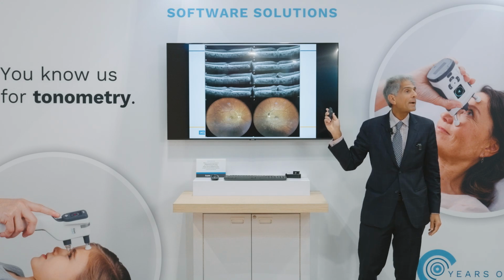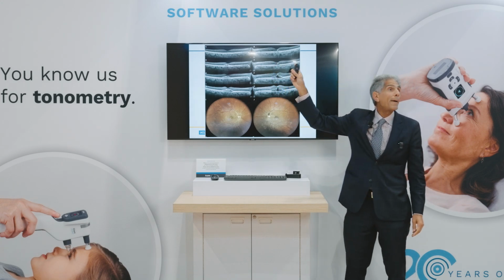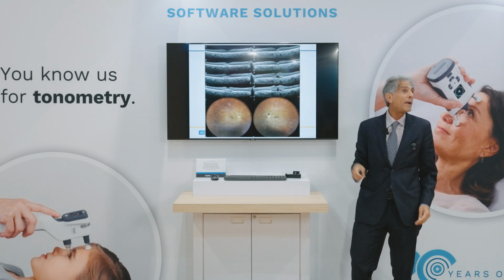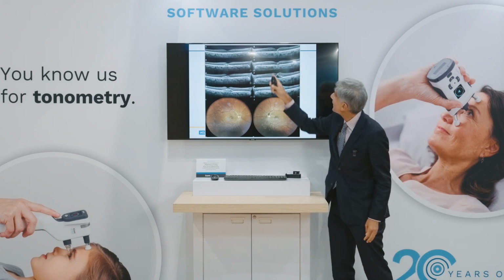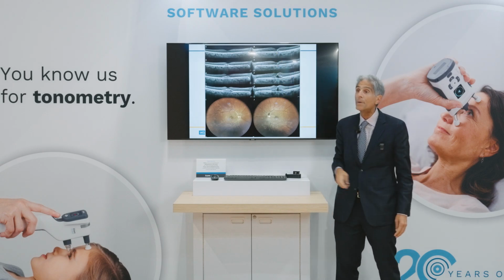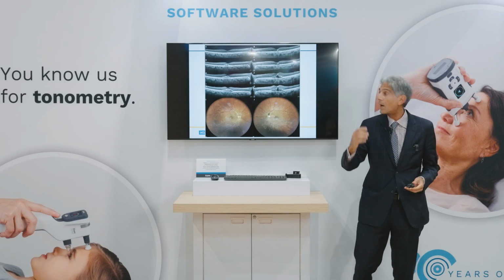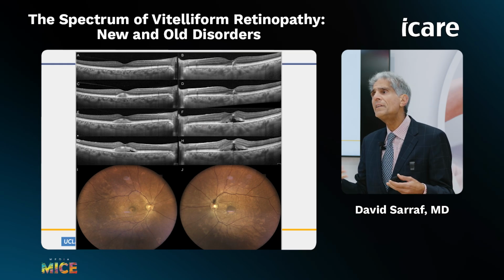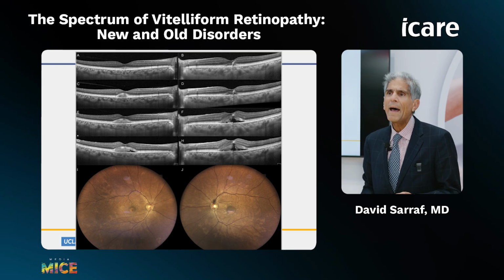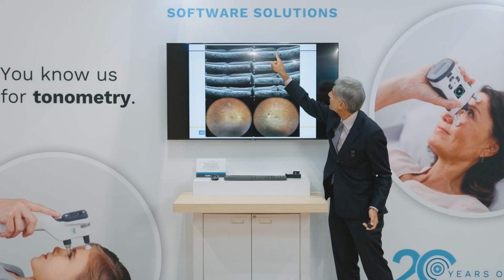I want to finish by telling you about this very interesting case. If you look at the top panel, this was 5 years ago. A 77-year-old patient came into our clinic, and he had a vitelliform lesion in the left eye with some evidence of RPE breakdown. You can see the plume of hyperreflective foci. He was 77, and he didn't relay any family history to us of Best disease or pattern dystrophy. It was very asymmetric, and he had a very thick choroid.